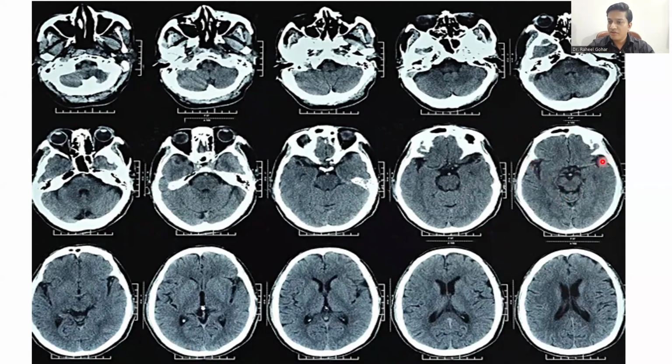These are the sylvian fissures. This is the interhemispheric fissure. These are the frontal lobes. These are the temporal lobes. These are the parietal lobe and the occipital lobe. In the center, because the tent was like this, it was not a straight structure. So this structure here is the cerebellum, and as we move upward, you can see the third ventricle and the frontal horns of the lateral ventricles. This is the calcification of the pineal gland. These are the occipital horns. In the occipital horns you can see the choroid plexus, and this is the calcification of the choroid plexus. Again this is the sylvian fissure, and as we move forward you can see all the things.